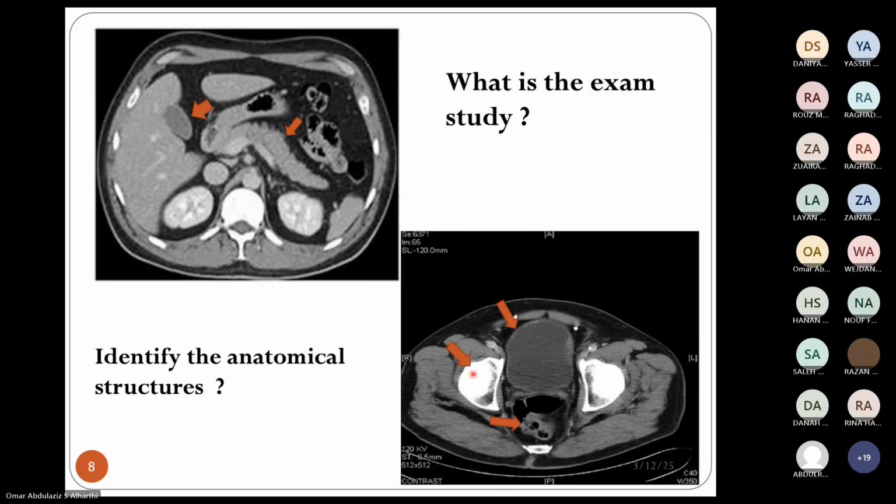What is this? Pelvic bone. Which bone? Sacrum. No. Iliac. It's part of the iliac. The lower part of the iliac has the hip joint.